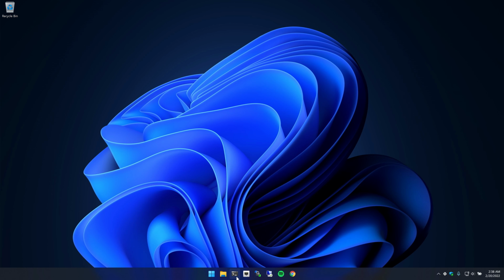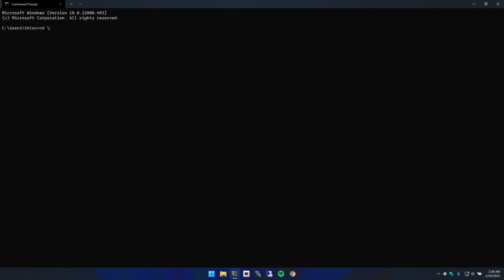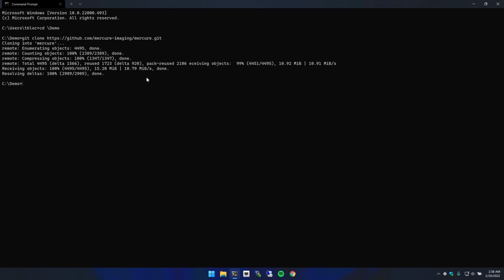Okay, I'm now using my Windows computer and I can open a command shell here. And what I will first do is check out our Git repository. After cloning the repository, you can go into the Mercure folder and then in the subfolder addons, vagrant and then systemd.